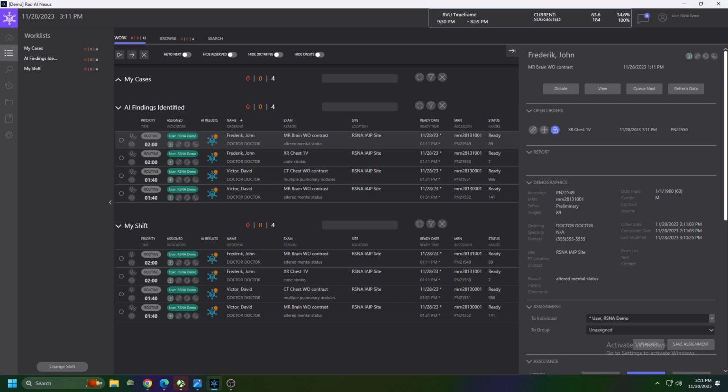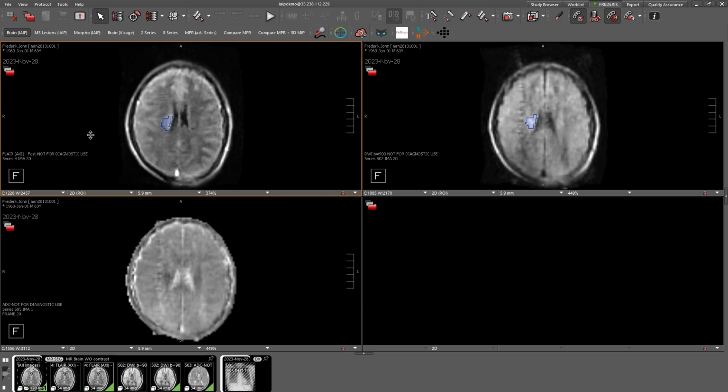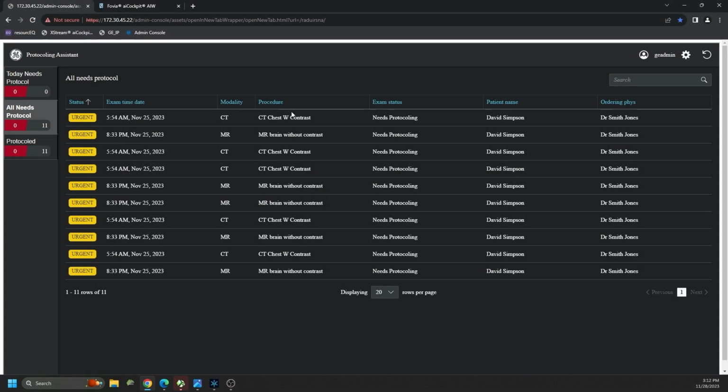The algorithm, as mentioned, is Cerebra's Apollo software, which is a tool on the Swoop MR and detects the infarct on DWI and FLAIR, and as a result generates a DICOM segmentation object that can be viewed on the Visage PACS. We can see the region of interest in the area of infarct. If the radiologist agrees that this is indeed acute infarct, they can accept, reject, or modify and dictate the report accordingly. Let's move on to the outpatient setting.